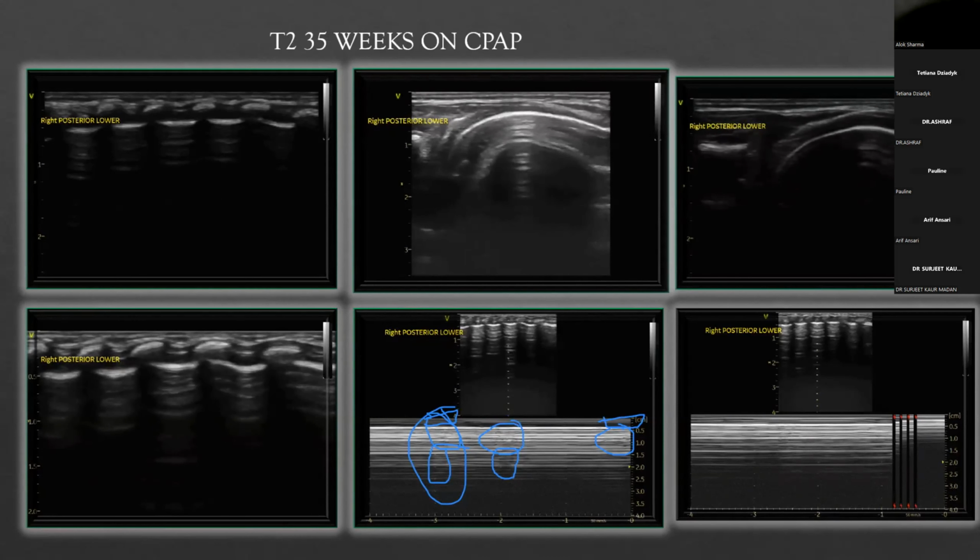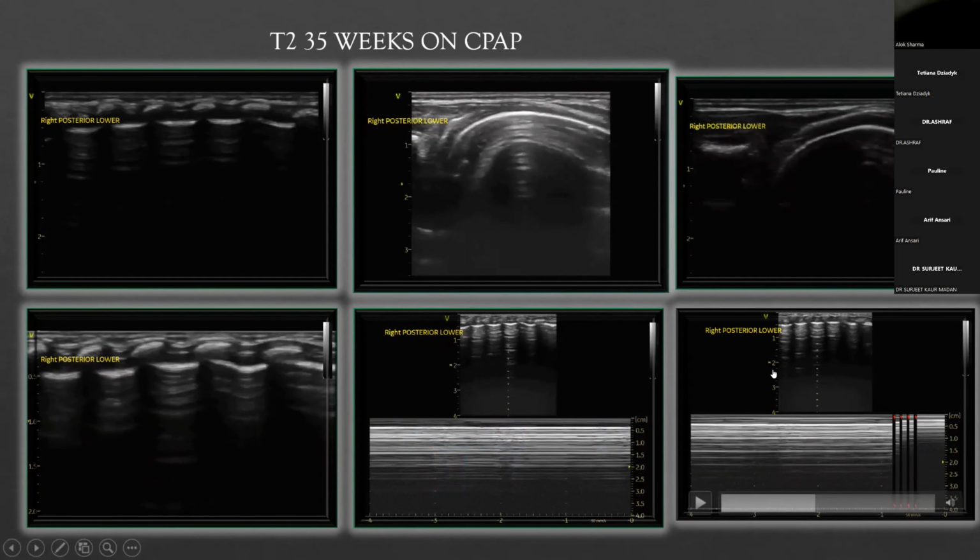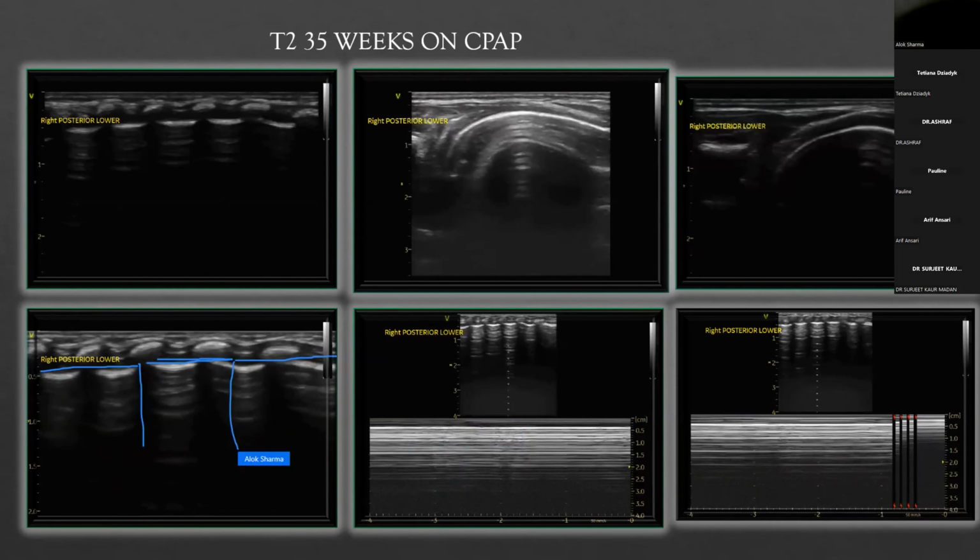Again, what I'd say is that if your baby's not got much in terms of respiratory distress, the one thing that Dr. Yusuf, that Nadia will talk about when she talks about POCUS is what we call air bubbles. Now, air bubbles, and I will show you a case towards the end of the course, maybe a small area, like you've got sliding on this side, you've got sliding on this side, and you have a small pocket where there's no sliding. And what you can see is the interface between M mode of a seashore sign on one side, a seashore sign on the other side with a barcode in between.